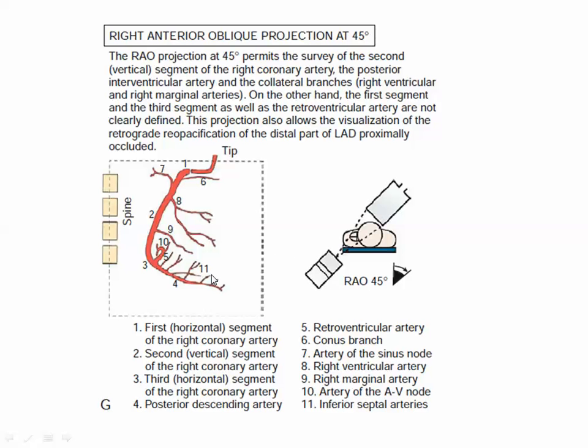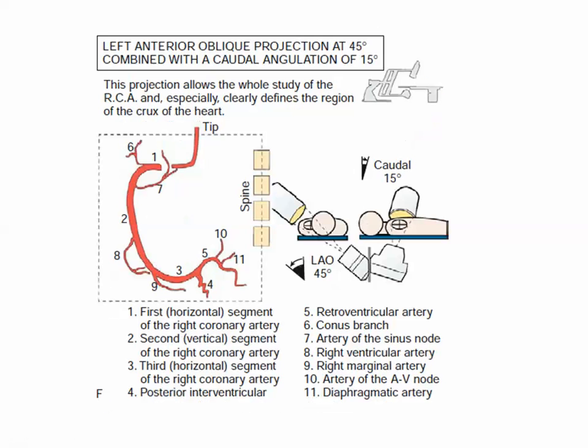And this is the plane of the atrioventricular groove. Here's the aorta. Where is the pulmonary? In front, anteriorly. This is anterior, so the pulmonary will be here and the RVOT will be here. Yes, subpulmonary. The conus is subpulmonary. So this is the conus branch. Okay, it's clear, while in this one the conus is here.